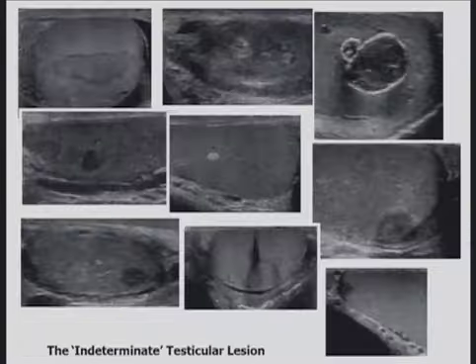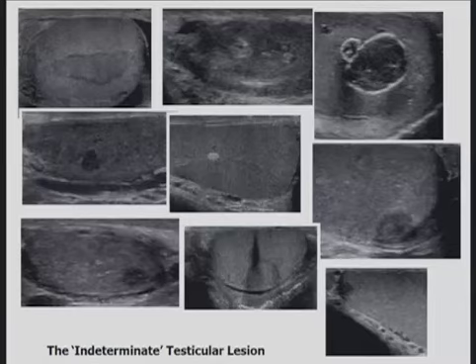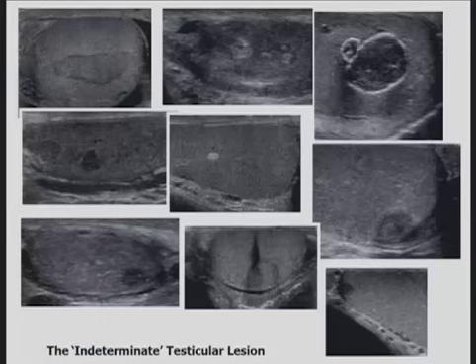There are a number of lesions within the testes which cannot be characterized fully on the B-mode ultrasound examination. This slide shows you a number of lesions which were not clearly identified prior to operation. These patients had their testes taken out, but these lesions were all benign.